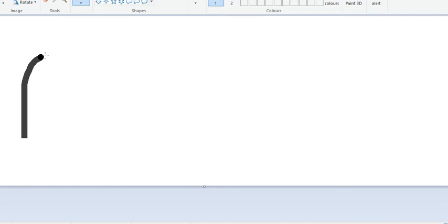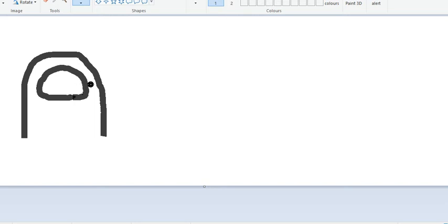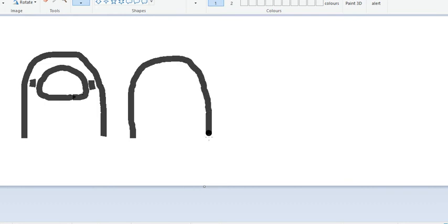This is a cartoon of a finger, the distal end of a finger. We've got the nail bed. You can see it's quite fair to say that the nail bed is equidistant to the skin margin. This is a good position for a DP. And technique error here, a bit of rotation from the nail bed, and the finger looks a little bit rotated to the left here. This is going to significantly impact the X-ray.